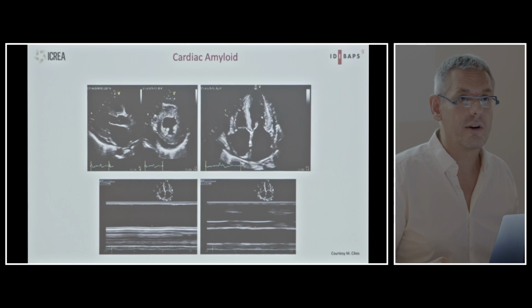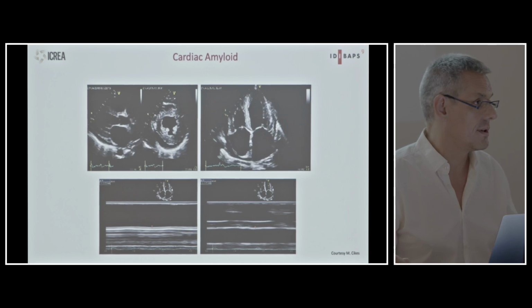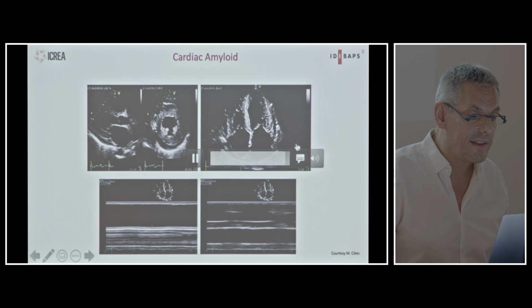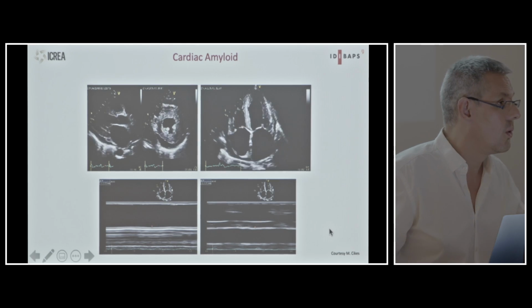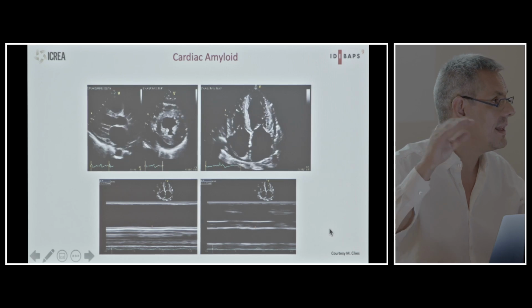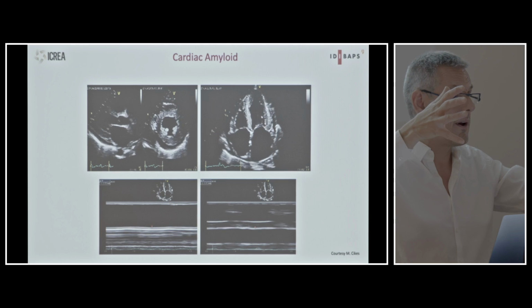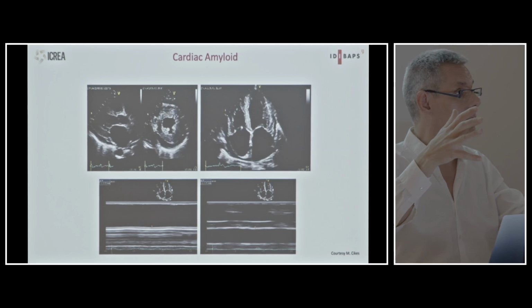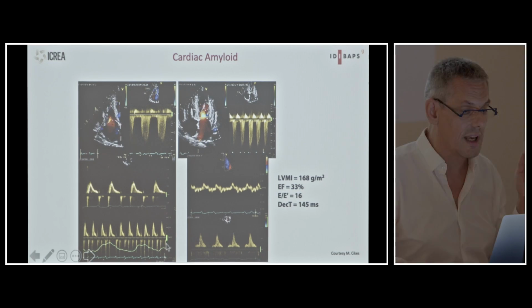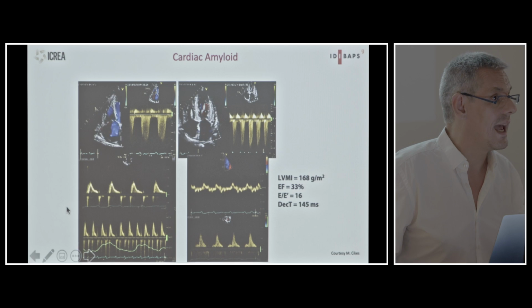Going quickly to some other of the underlying hypertrophic substrates, amyloid is one of them. What you see very typically in amyloid is that when you do a ring motion, there's no longitudinal deformation. Neither septal, neither lateral. This ring is static. Very often with these very, very large atria. And something which is also very interesting to look at is atrial contraction. Because, for example, when you start looking at filling patterns, very often they have problems with atrial filling.